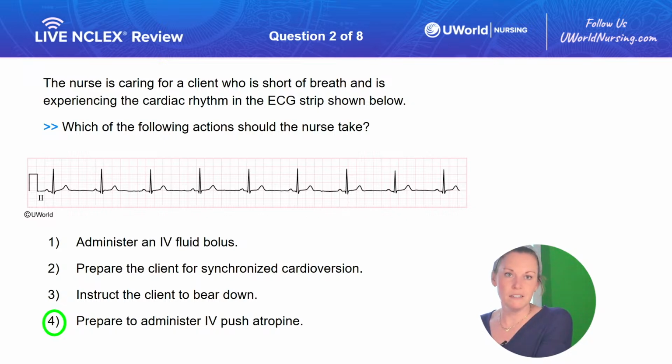But again, what we see on here, our PR interval is less than those 5 small squares. Our QRS complex is 3 or less squares, which is appropriate. So everything is working correctly. Signals are making their way around the heart, but it's just beating slowly.